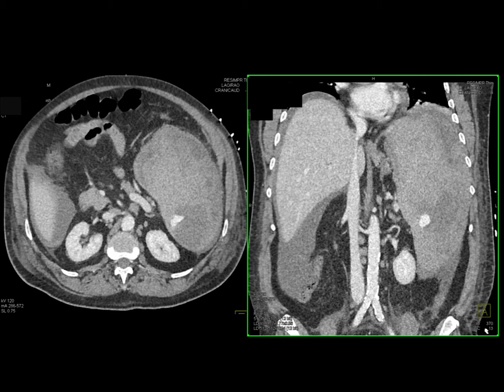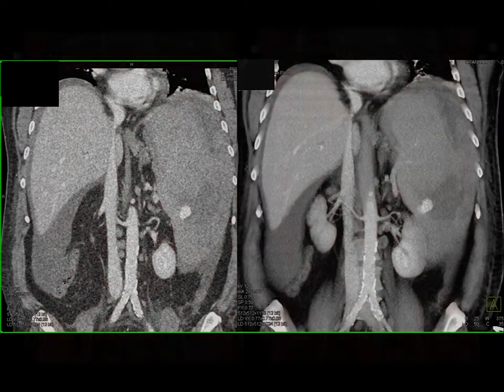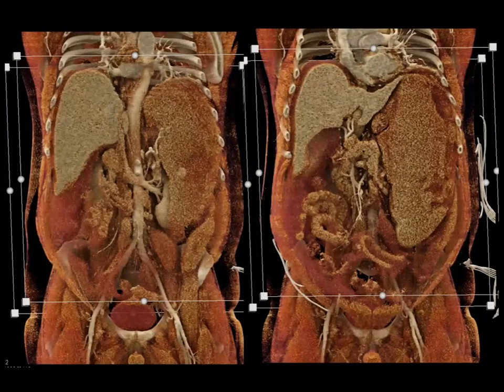I mentioned earlier in part 1 of the talk about spontaneous rupture due to intrapancreatic pseudocysts that track into the spleen and can cause, with minor trauma, spontaneous splenic rupture. But here's another one. So you see the active bleeding, you see the infiltration of the tumor in the spleen, but this patient will end up with a splenectomy. There's blood beneath the liver. Here it is with cinematic rendering, very nicely showing you the textural change and the infiltration of the patient's liver and the splenic involvement as well.